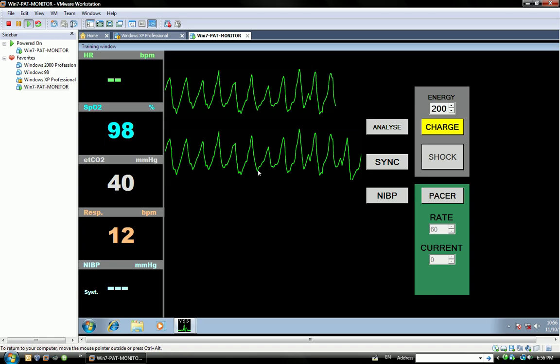And if it's not 120 or 100, it will violate the guidelines. That's why you should keep this in mind and continue CPR with a BPM of 120 or 110 or even 100, as these are important for safer CPR performance and CPR performers.